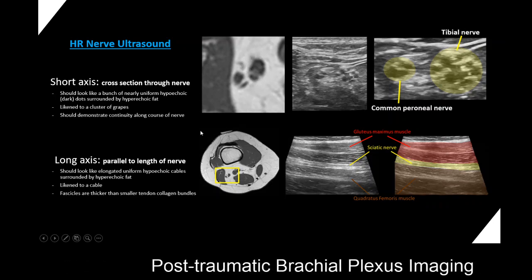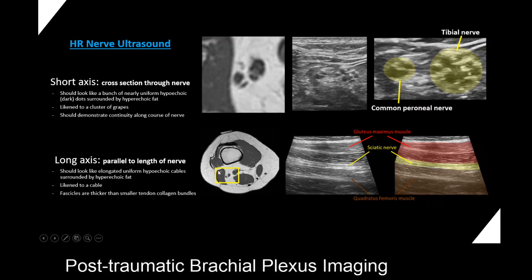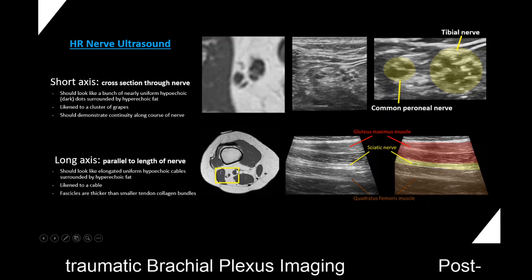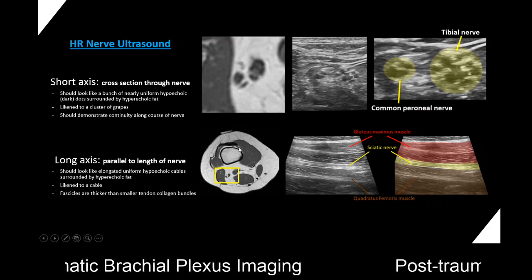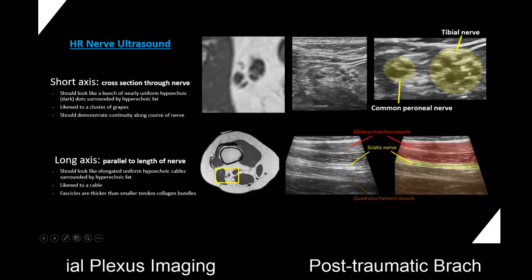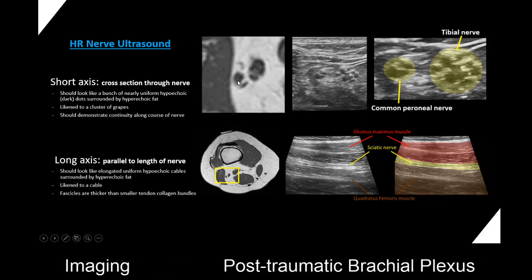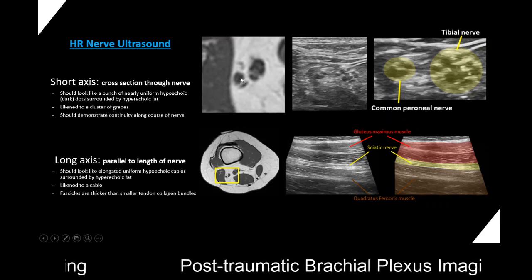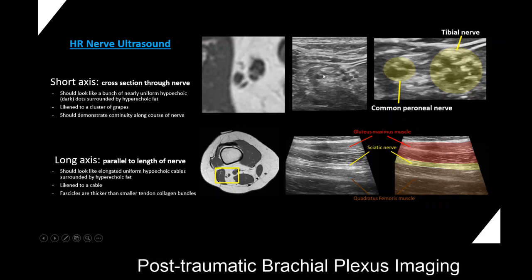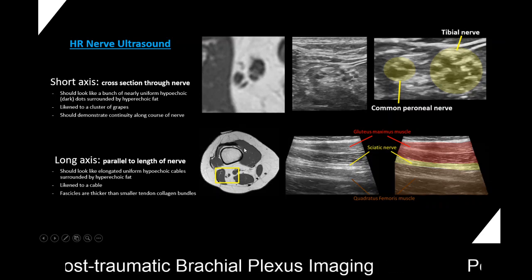And part of that is because the majority of the MRI image that we look at here is not represented by nerve. In fact, more of it is adipose tissue, muscle, femur, tendons. It's just a small part of the pixels on this picture that represent the nerves. And so you see this is the common peroneal nerve here, where you really have a difficult time differentiating the fascicles compared to here, and the same thing with the tibial nerve here compared to here.